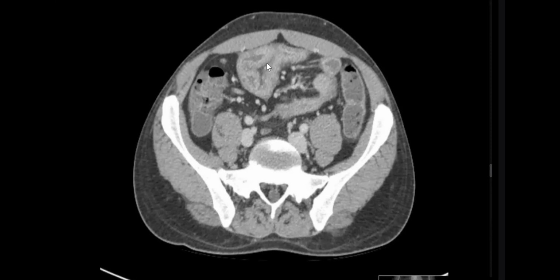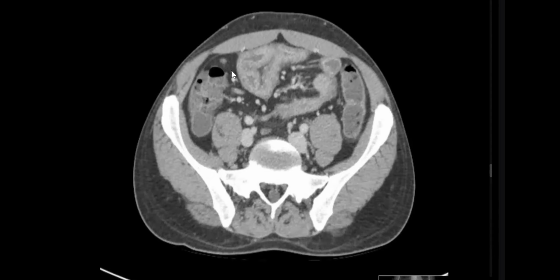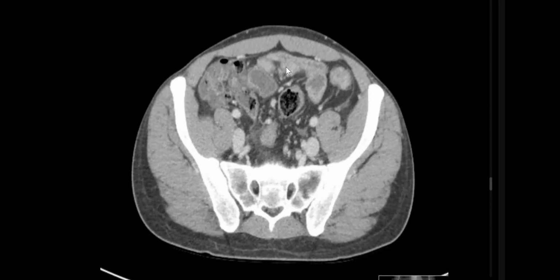In the dilated bowel loop, I want to exclude any extraluminal gas. I'm suspecting a focus of air here. I just want to check if it is inside the bowel or outside. By the way, some lymphadenopathy. Good. So I want to check lung window and other planes to see if this focus of air is inside or outside of the bowel. Good.